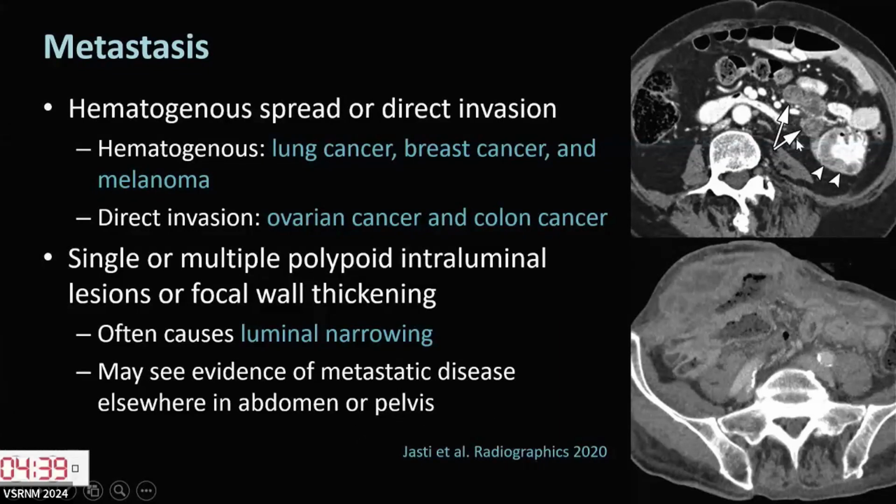So this case is metastasis to the small bowel, and also we see the lymphadenopathies. And here is disseminated peritoneal metastasis involving the small bowel.